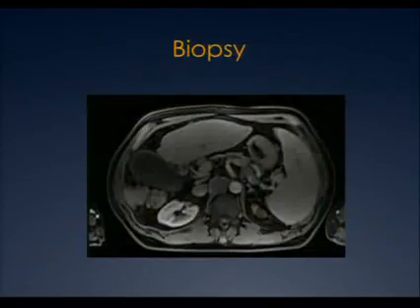How about complex biopsies? Everybody's at a place that somebody's doing biopsies. So, to orient you, this is an MR. This is the aorta, big red. This is big blue, the IVC. In between the two of them is a blob that shouldn't be there. This is a poor guy that has HCC, hepatocellular carcinoma, primary liver tumor, and it's metastasized, probably, to that node.